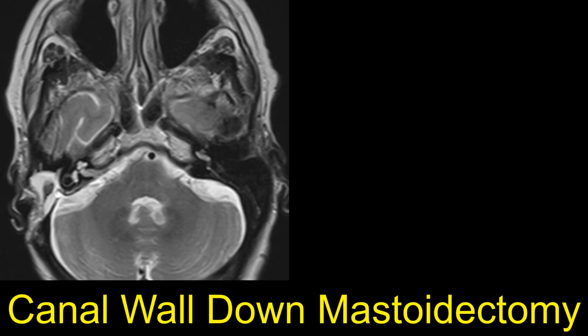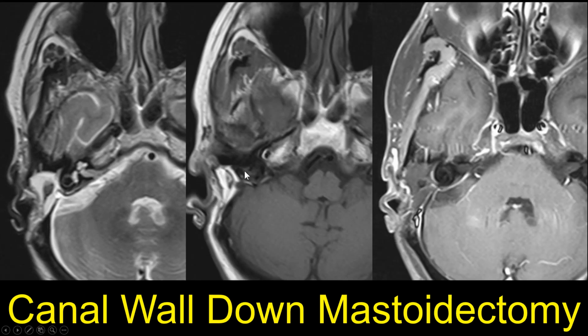So we can compare that T2 with the T1 here before contrast, and we see the very bright fat signal intensity of this fat packing in the surgical bed. And when we do a fat saturation, we see how that suppresses out, with the fluid that's in our surgical cavity. So again, we remember the nose in the head and neck world.